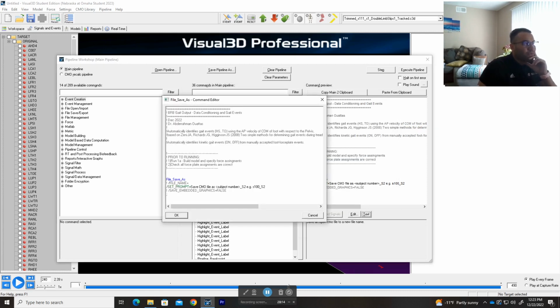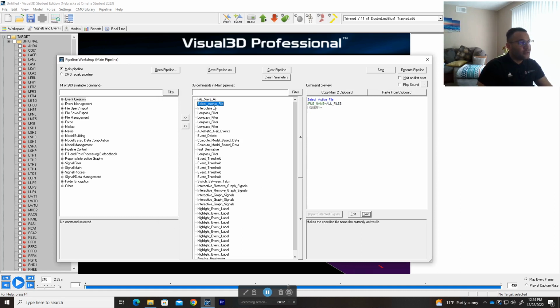And here you just write your information: created in December 2022, my name, the actual paper that you're using, and then the command, like the automatic one. You can write anything you want in here. Alright, so then Save As.